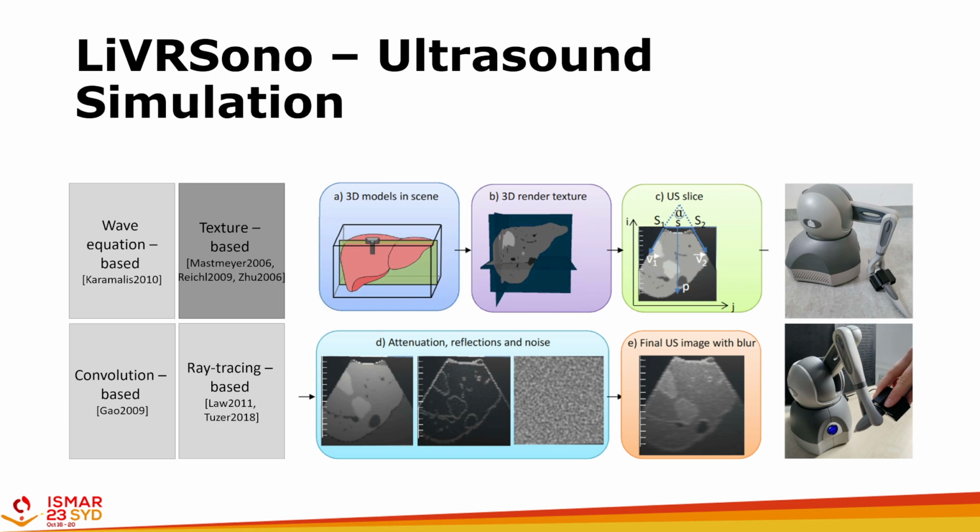As input device, we used a grounded haptic device with force feedback. This is quite important in our case because in reality the probe is also slightly pressed on the liver surface, and it would be very difficult to move the probe on the liver surface in the VR application without feedback or resistance. And to have a more realistic feeling and hand position, we printed an attachment to simulate an ultrasound probe, which is the black part.